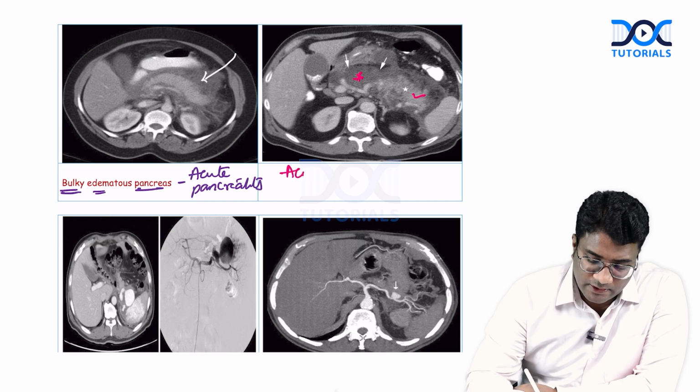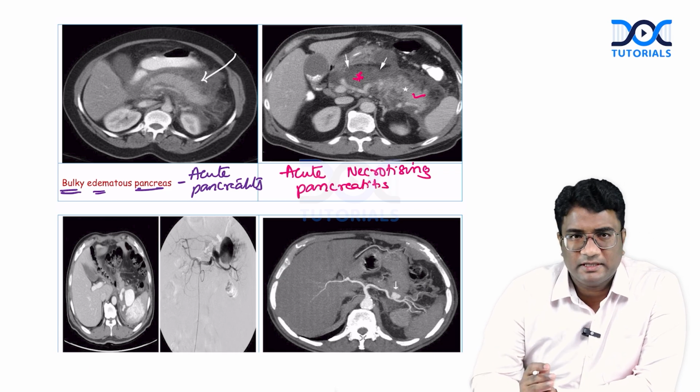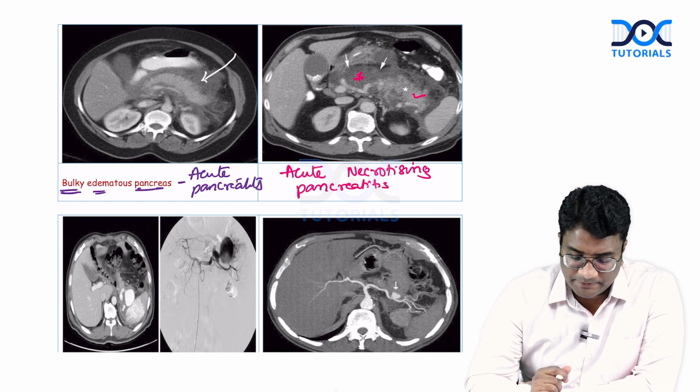This is acute necrotizing pancreatitis, right? You are seeing the enhancing and non-enhancing areas in the pancreas.